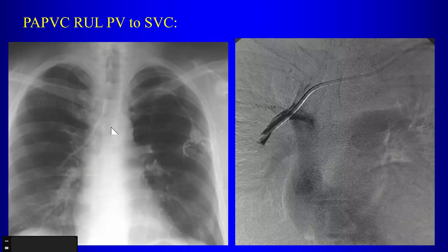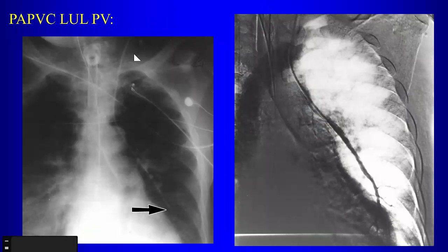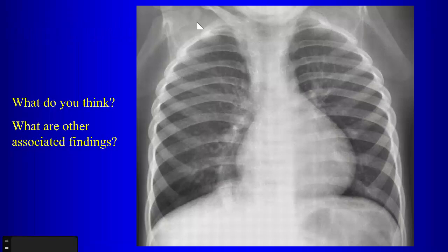Sometimes, as we've discussed, these abnormal catheter positions or these catheter paths might be secondary to partial anomalous pulmonary venous return. Here is another example. This one, of course, when you see this, you're going to freak out. Where is this thing going? It turns out it's going into a pulmonary vein. Fortunately for this patient, it's not sitting out there in the lung. Okay.